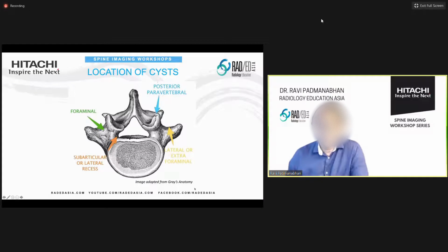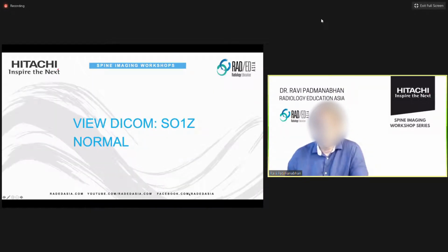Okay, so let's look at a normal case to begin with. Just give me a moment. I'm going to change over to the DICOMs.